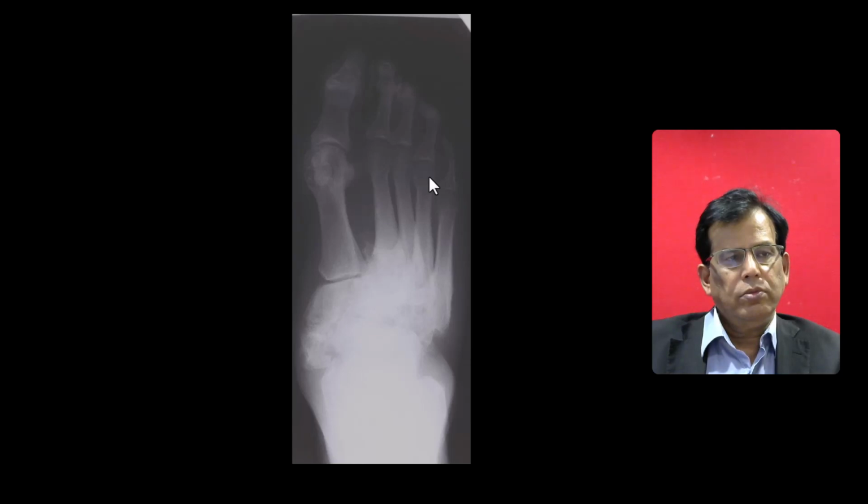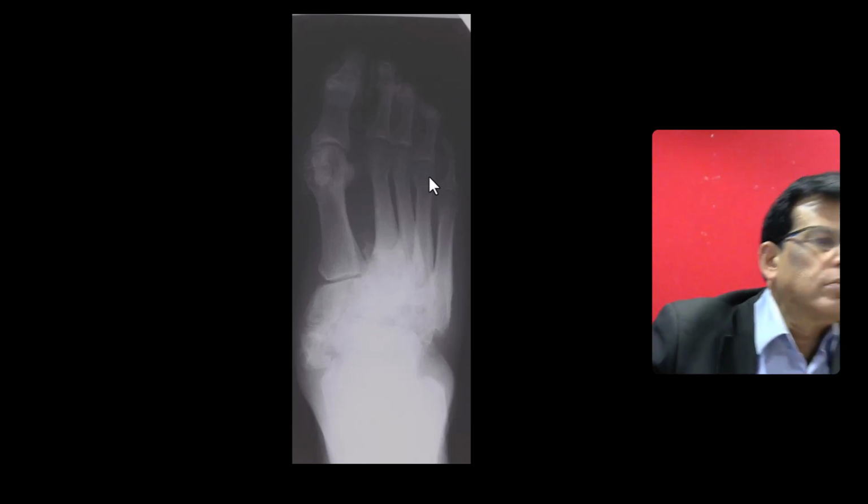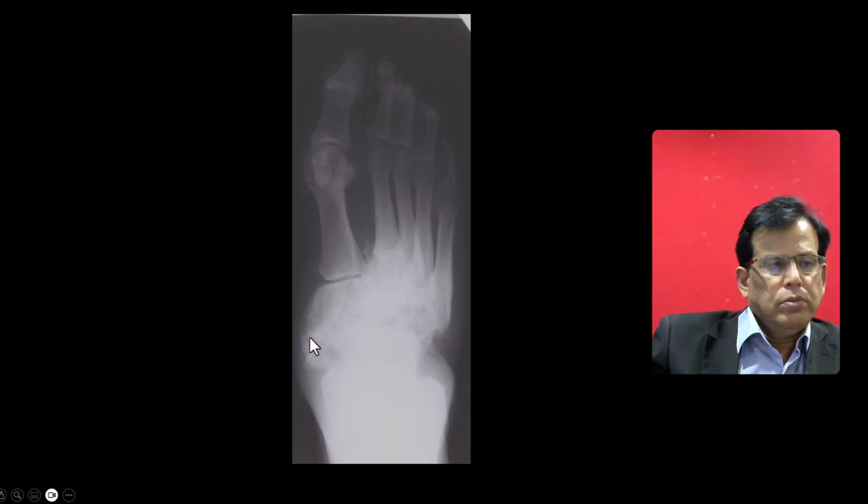However, distally, if I see the phalanges, there's no component of acrosteolysis, and the interphalangeal joint space and metatarsophalangeal joint space is preserved, but I cannot make out the joint space here in the ankle and talar subtalar region. And there is some component of cortical breach in the medial aspect of the foot bones. So to combine all the features, my top differential would be a neuropathic joint, Charcot joint arthropathy.